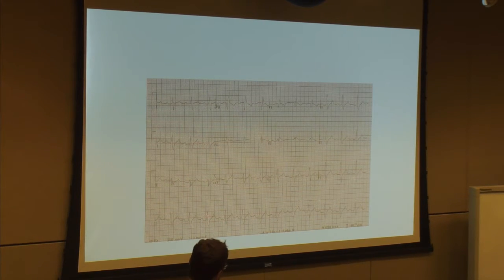My QT interval is a little outside of 2 big boxes, right? Still probably within half the distance here, but I got a bizarre wide complex sinus rhythm, right? Doesn't fit classically into a left bundle, right bundle. And I got a prominent R wave here. So I got a number of cardiotoxic things going on here.